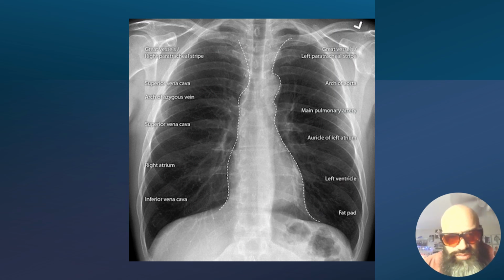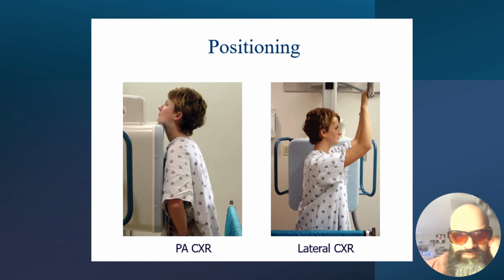This is another one as well. This one has the cardiac and aortic borders outlined for you here, costophrenic angles as well. We have regions as well that are black, which are filled with air. The hilar vasculature is right here in the perihilar region. But these are helpful to get you a clear-cut understanding of normal when you start to evaluate abnormal.